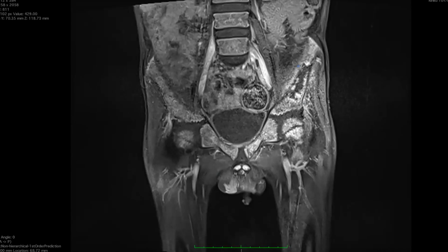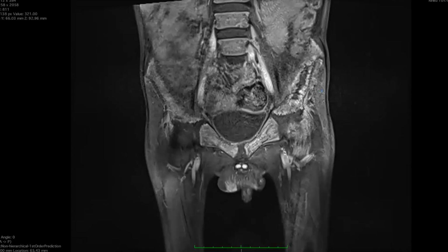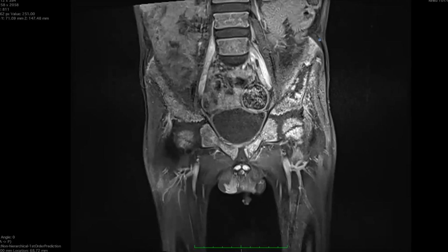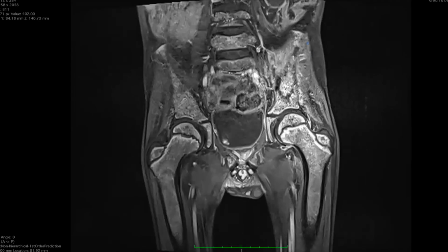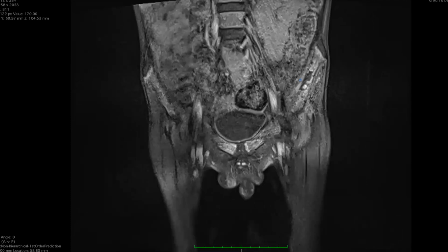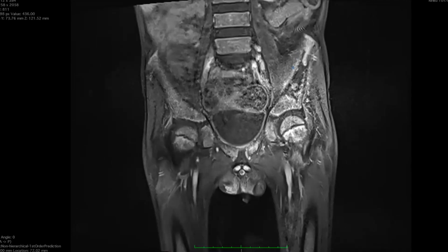Anything that is not enhancing or peripherally enhancing, which is showing diffusion restriction, always think of a loculated fluid or an abscess. As you can also see on the post contrast images, there is preferential enhancement on the left sided pelvic bone and the femora, and there is more enhancement along this non-enhancing area here, and there is enhancement of the left sided iliopsoas and gluteal muscles as well.